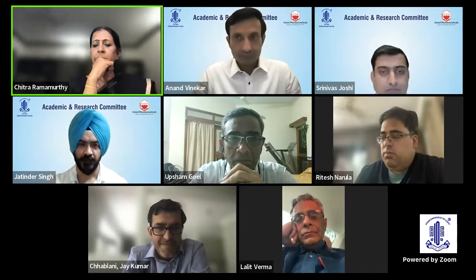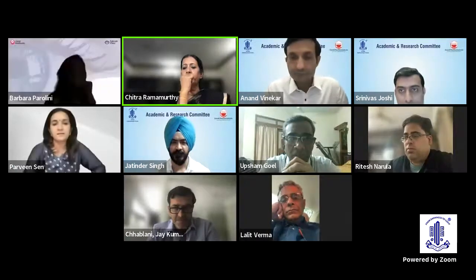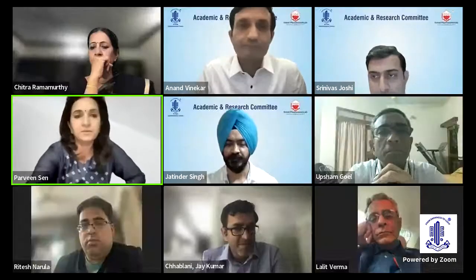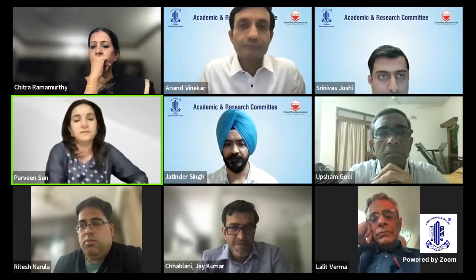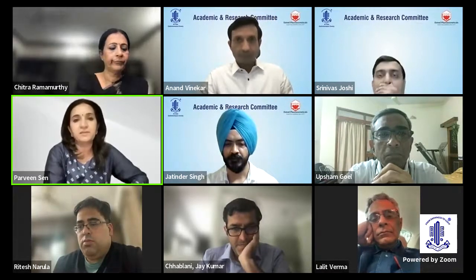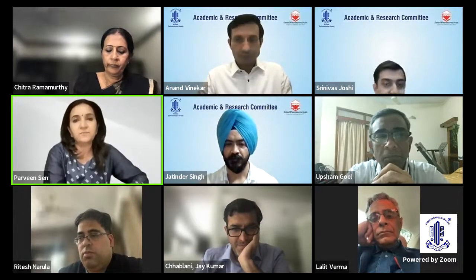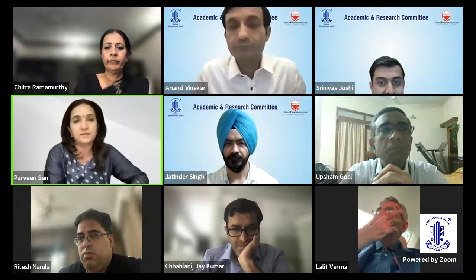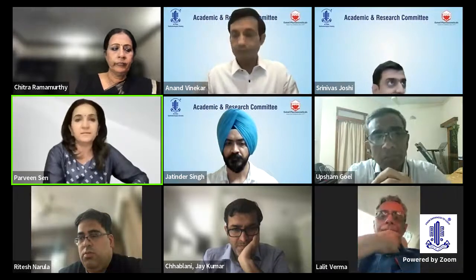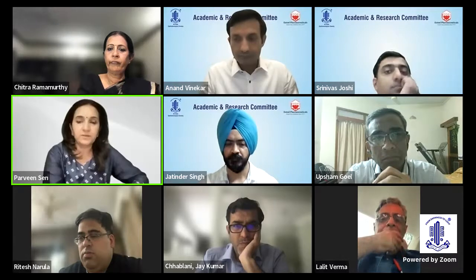Dr. Parveen, are you there? Yeah, so I think I agree with Dr. J. We have these intraretinal cysts, and as Dr. J has mentioned, we divide them into the exudative and the degenerative ones. Exudative ones are the ones which are present early on in the course of disease, and they respond better. But if there are large degenerative ones, they will not respond to treatment.